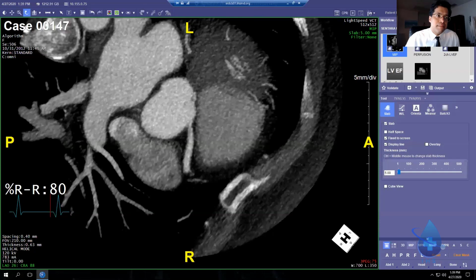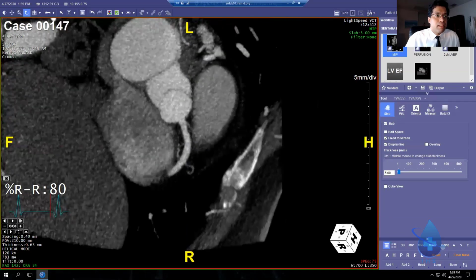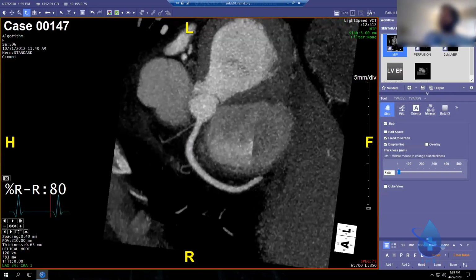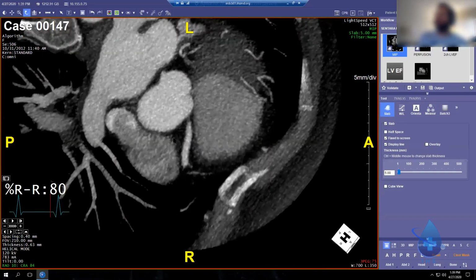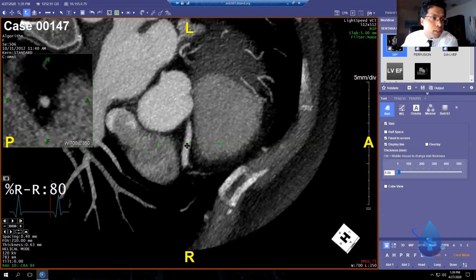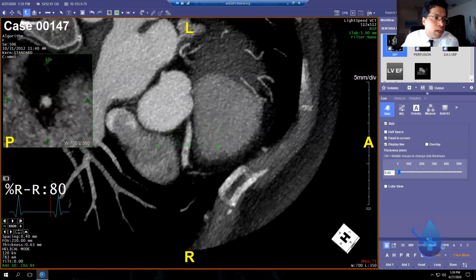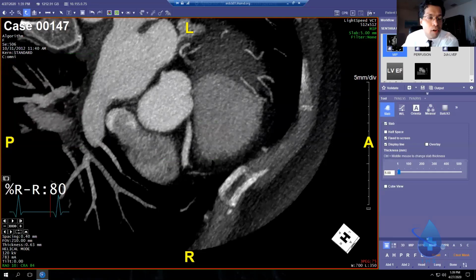Okay? So now on the MIP, we move left and right, all the way to the edge and back. And then all the way. Mo, excuse me, is the MPR the same as the G button? Or is that different? Yes, it's the same. So if you hit G, you can do it this way, but it's going to take you longer. In general, this is the same thing. That is the MPR. So if you see a single lesion, you could do that, but then you're going to be hitting G back and forth all the time.